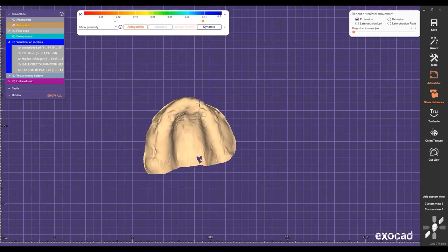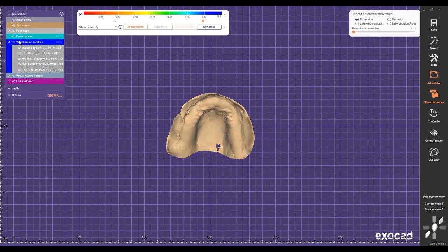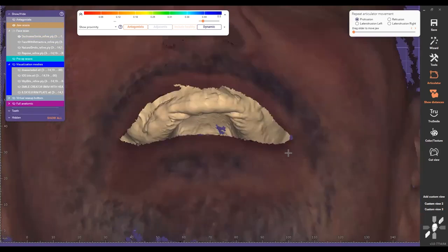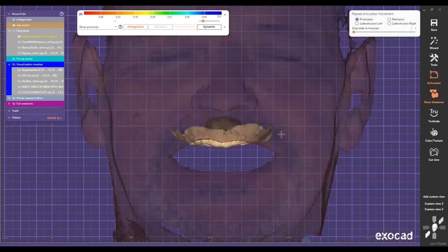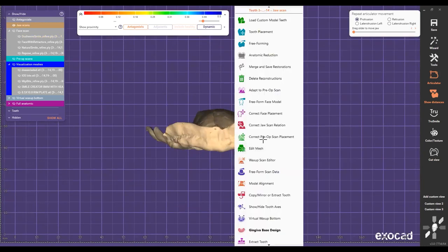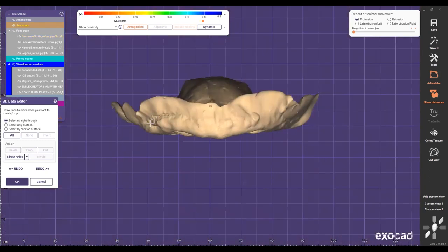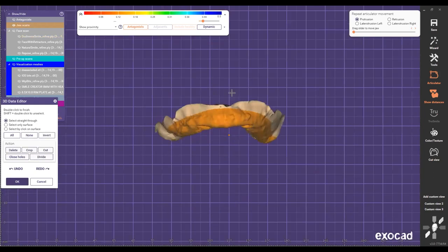So now from here, I'm gonna go ahead and start checking the facial scans in Duchenne Smile. And I wanna make sure, from Duchenne Smile, the goal of the Duchenne Smile here is to hide the transitional line. So what does that mean? I'm gonna go ahead and start chopping this and then just count 4 millimeters apical from this to here. So that way I know that I'm gonna cut enough bone, and I'm not gonna say, hey, just go ahead and cut 20 millimeters of bone.